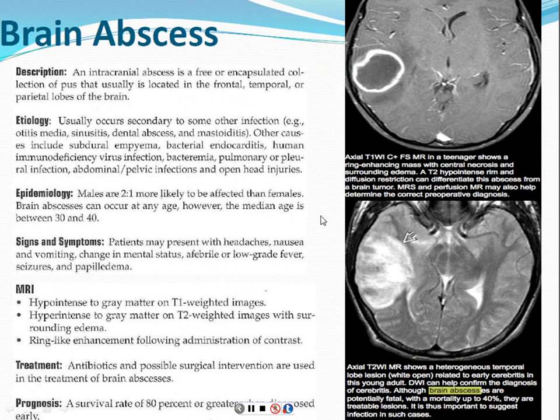This is a brain abscess. This is a little bit less common than things like strokes, but it's another thing to look out for. This is going to remind you a little bit maybe of that glioblastoma multiforme, the GBM tumor, where there's a lot of enhancement around the edge, but usually the GBM has more enhancement in the center as well. This is really a ring of enhancement, but like the GBM, it creates a lot of edema around it on T2-weighted imaging. You'll see all this white signal intensity around it, because the bacteria are very irritating to the brain. And of course, on T1-weighted imaging, that's this kind of low signal intensity area there.